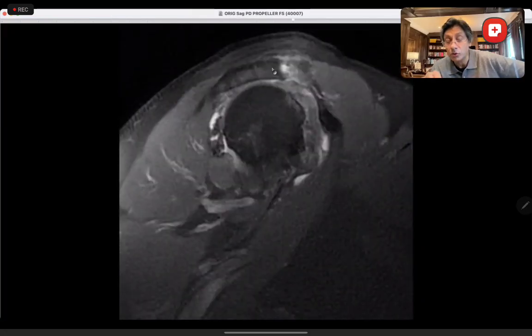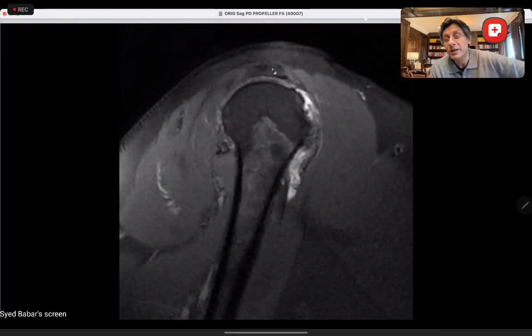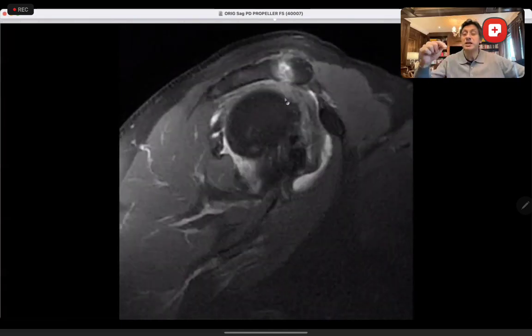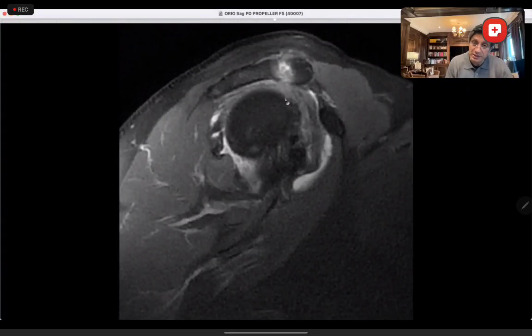That shape causes impingement, but people with type 3 will be normal. People with type 4 would have normal muscles. And here, it's probably a type 1 or a type 2, and you've got a full thickness tear. So that shape is important for impingement, not for tears. The tear is a phenomenon which occurs irrespective of the shape of the acromion.